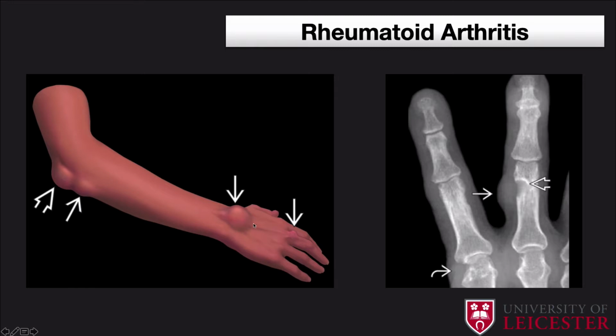Imaging of these lesions can mimic other soft tissue abnormalities. So what is going to point you in the right direction on a plain radiograph? Well, it's the fact that there is a soft tissue nodule with erosive change. In this case, in addition, the patient has a positive serum rheumatoid factor, and that's where your clinical suspicion is extremely high, and you've got to think about rheumatoid nodules and rheumatoid arthritis as the underlying condition. So here we've got a PA radiograph of just the fingers, and you can see this focal soft tissue swelling, and this is in keeping with the nodule.